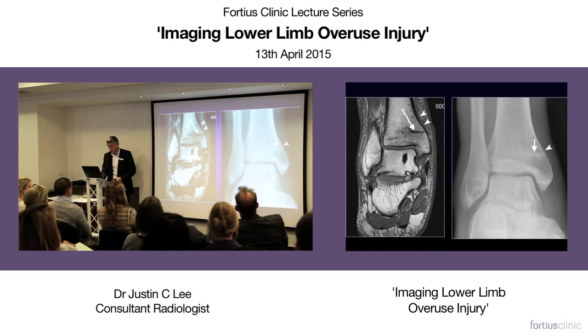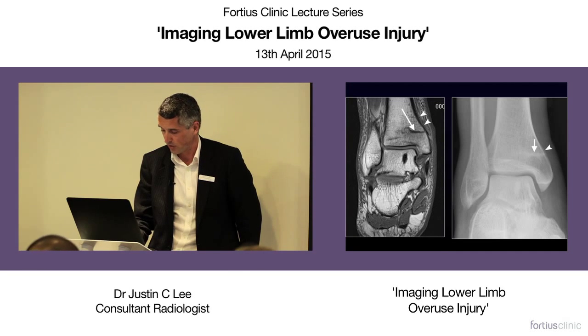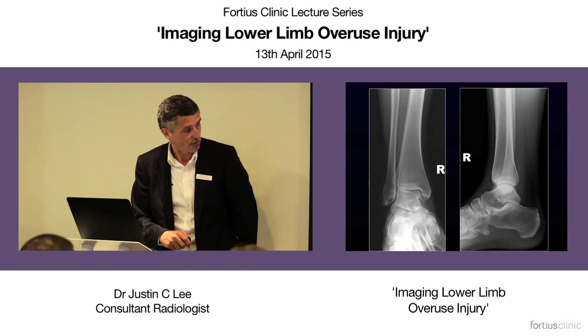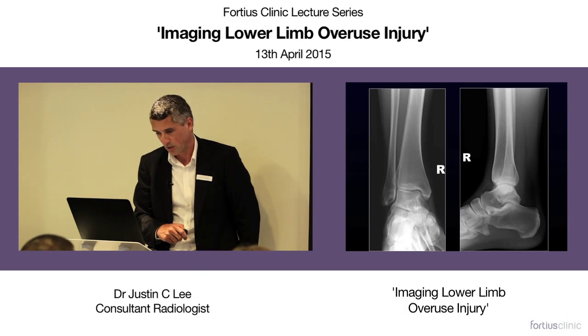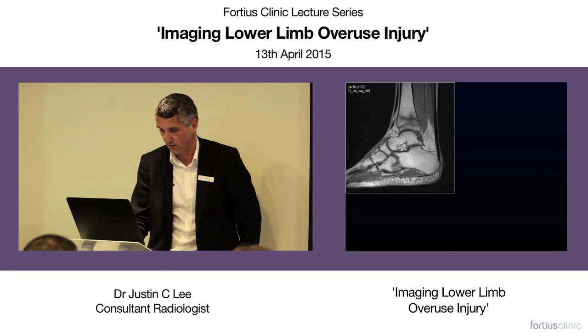This again is the distal location for a stress fracture in the tibia with some periosteal thickening, and this is one of the problems with relying on x-rays. Now this x-ray actually shows it quite nicely, but that's about as good as you're ever going to get for a stress fracture of the distal tibia, a faint white line. Up to half of radiographs in the presence of a stress fracture are actually normal, and that includes the metatarsal. If I look at this x-ray here, you might say, well, what's that? Well, possibly, but you wouldn't really put your mortgage on it. Maybe that one, okay, fair enough.